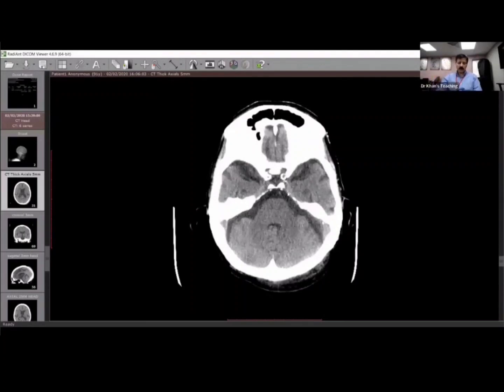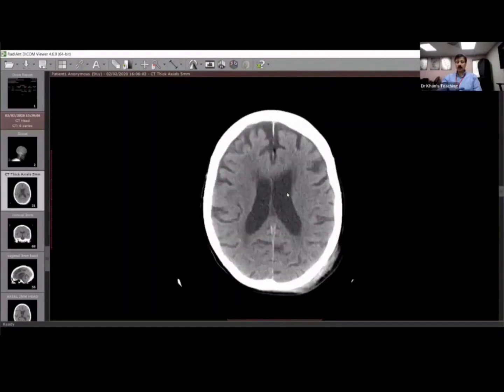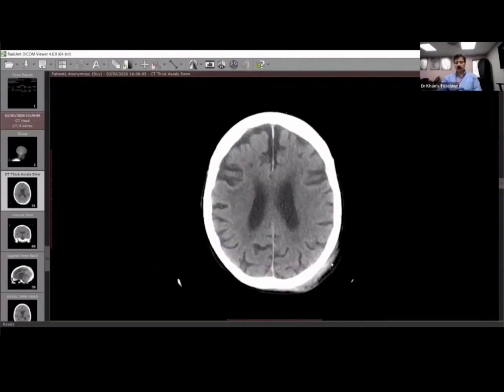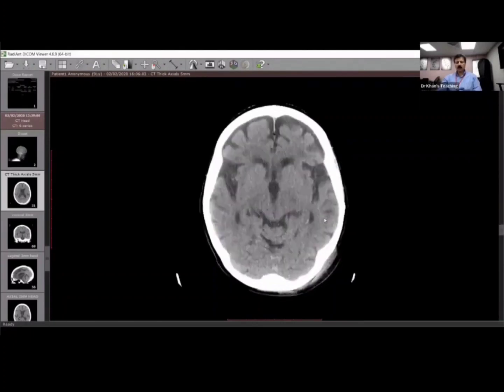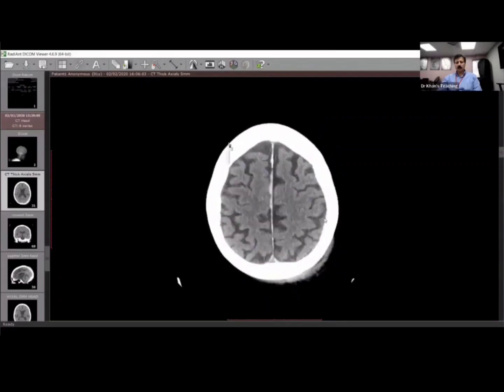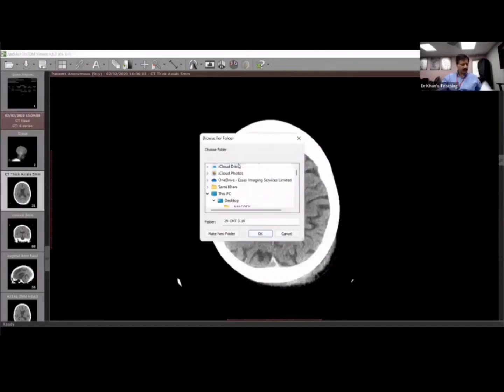Well done. So this was a classical, what we call observation film. The only thing is that there is a bit more, of course, I did not give you time for that because of time factor. The main finding you have picked up, it was an observation film trauma, subtle finding, but you did well to pick it up. This was parafalcine subdural with traumatic subarachnoid. Well done. So next case, please.